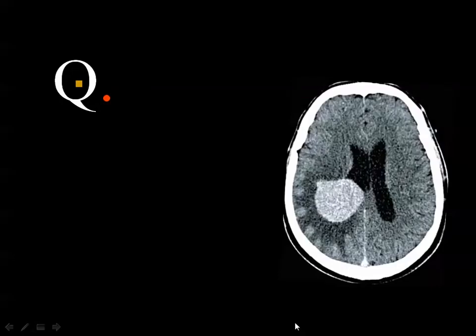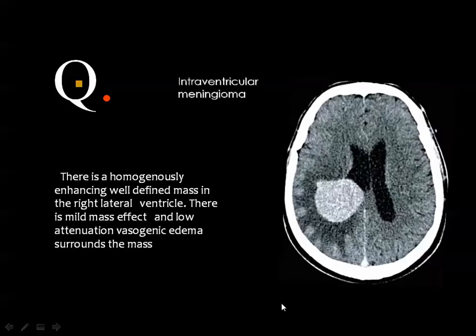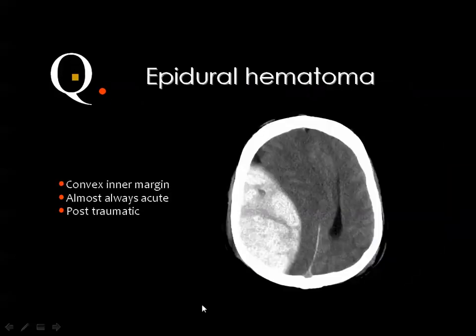When you say with contrast or without contrast, if you want to know, you look at the vessels. Like in this case, if you want to know if the patient was injected with contrast, you will see enhancement of the superior sagittal sinus. Here, you do not see enhancement. This is the density of the falx. And with contrast, you may also see some of the vessels enhancing on the cortical surface of the brain. And it should be written, of course, on the film whether this patient was injected with contrast or not.